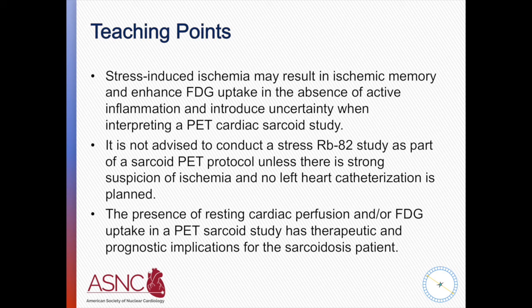So as we talked before, what's the ideal image in those patients with sarcoid is that we have a really good amount of blood pool without any uptake in the myocardium, which would rule out the presence of sarcoid. But at the other end of the spectrum, what's a positive PET study for sarcoid is usually what we call focal on diffuse. You have this kind of patchy confluence of FDG uptake on a diffuse background, which basically represents the presence of inflammation.